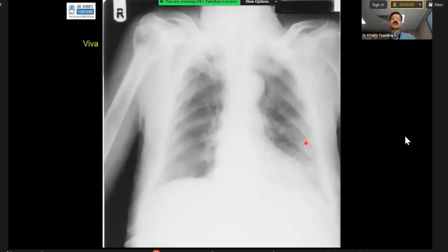Oh, the projection is extremely, I think, not a good one to show you on this PowerPoint, because it has become very, very high density. Having said that, it will be a bit unfair, but maybe you can make up. Can you just concentrate on this humerus? And anything wrong?